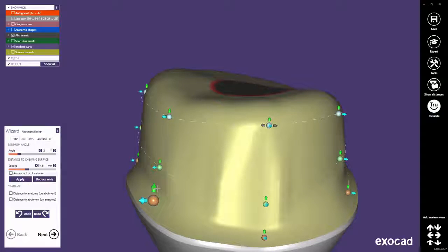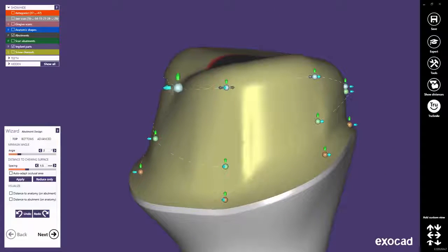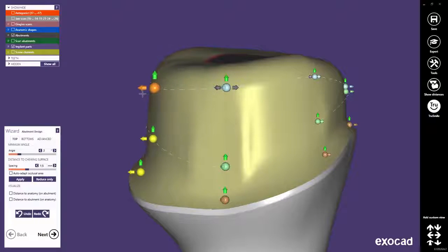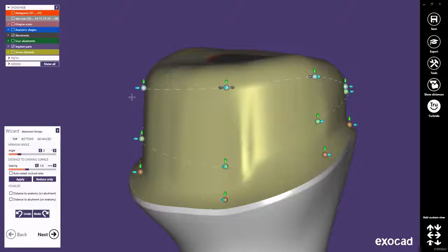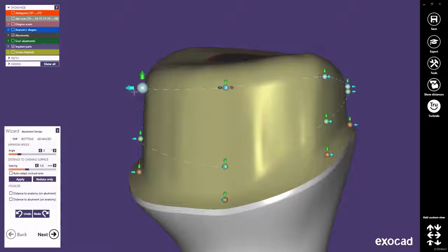Move points on the upper curve inwards to create a more conical shape between the upper and middle curve. Move points on the upper curve outwards to create a straighter shape, and cause the lower control points to move outwards, respecting your minimum angle. Moving the middle or lower control points inwards will move all points. Moving them outwards will cause only the lower and middle points to move outwards too. Let's see how to use this control point behavior in real situations.